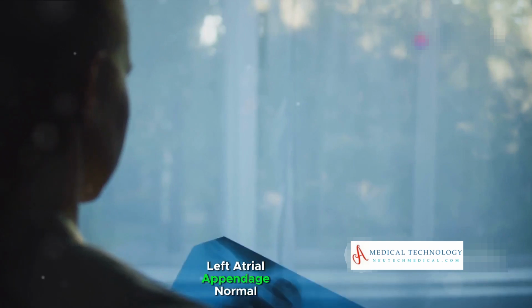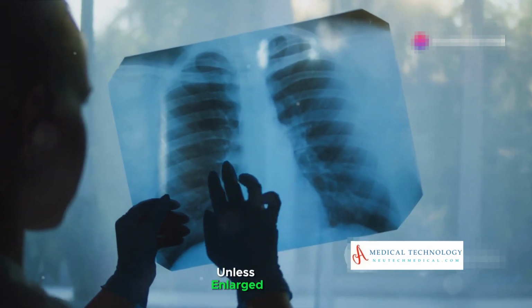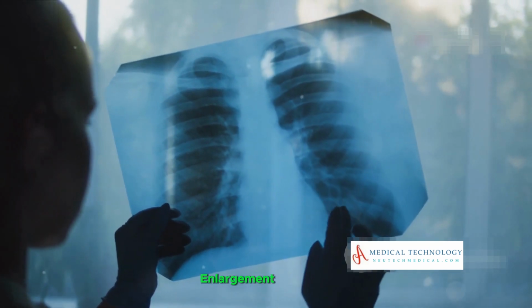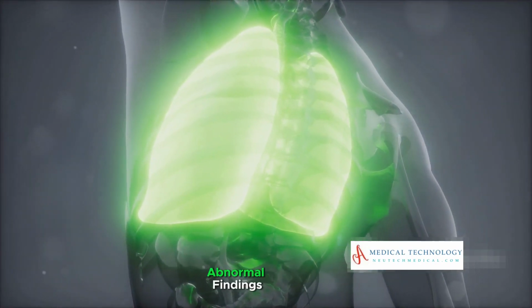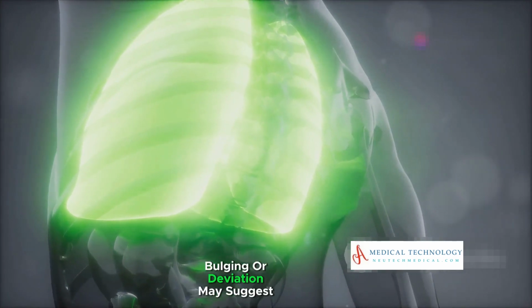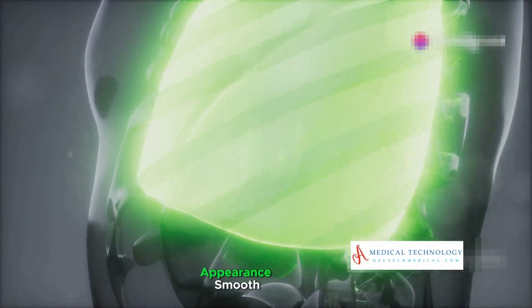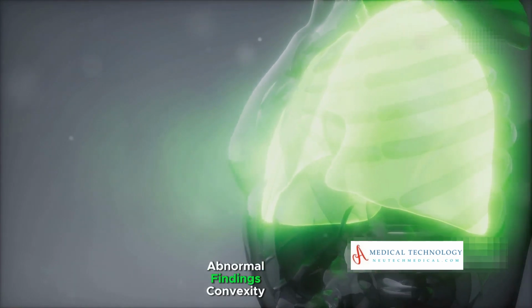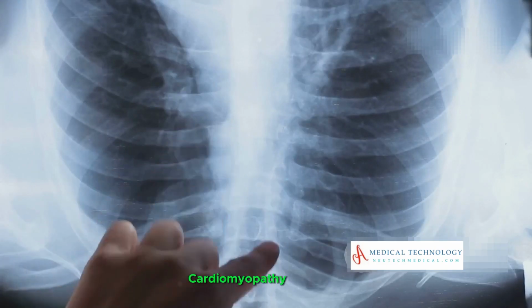Left atrial appendage, normal appearance: small outpouching, not prominently visible unless enlarged. Abnormal findings: prominence indicates left atrial enlargement. Para-aortic line, normal appearance: straight vertical line. Abnormal findings: bulging or deviation may suggest aneurysm or mass. Left ventricle, normal appearance: smooth, forms part of the left heart border. Abnormal findings: convexity or enlargement indicates hypertrophy or cardiomyopathy.